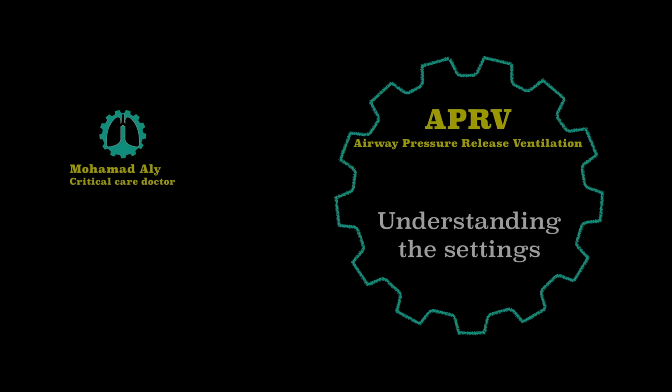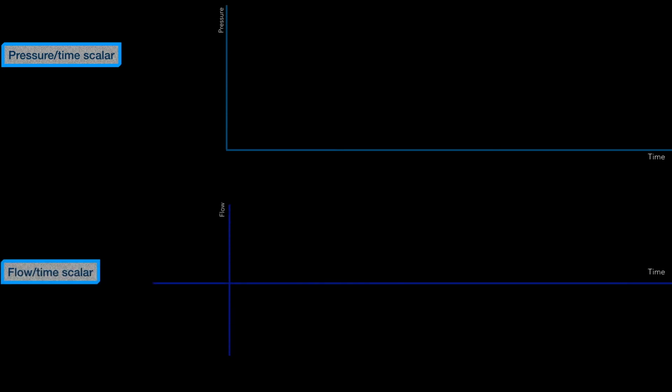Welcome to my second video about airway pressure release ventilation. Today, we will address the main settings using the pressure-time and flow-time waveforms, which are essential to understand APRV.